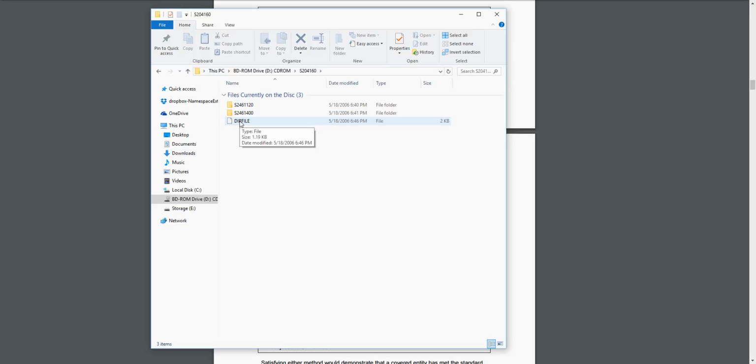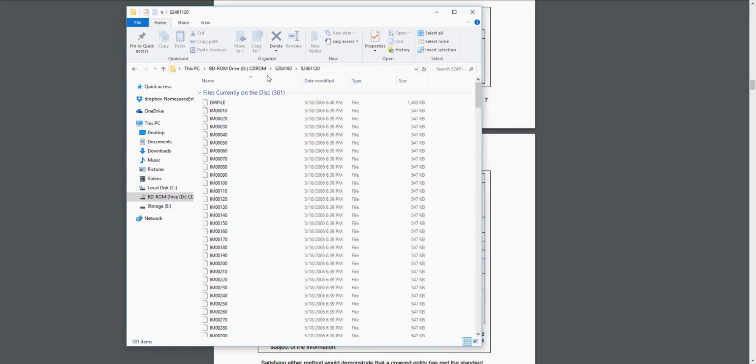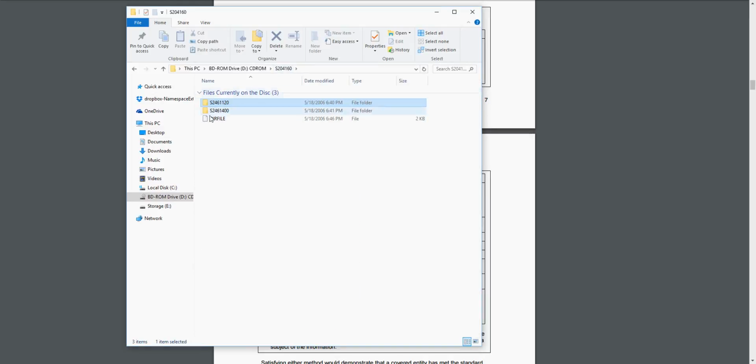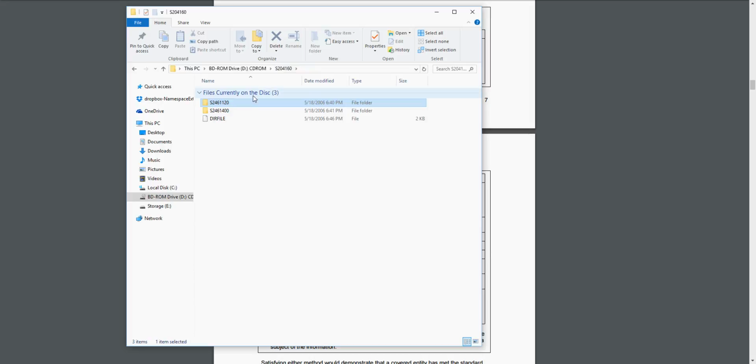It has a DIR file, which isn't useful for our needs. That has information about how the directory is organized. There's also 1 in each scan. A lot of times you'll get multiple scans, more than just 2. You may get 10 scans, and some of them only have 1 or 2 files. Those are typically scouts, which you don't care about. So you typically want the one with the most images if you're trying to create a volume of data.